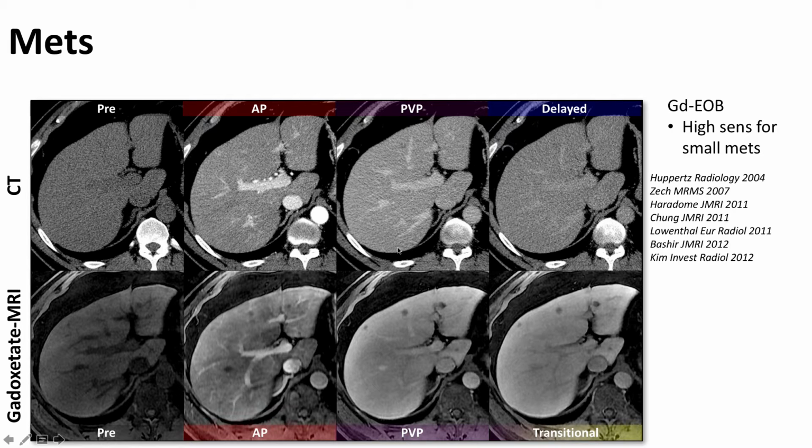Let's review some of this. All right, here's a patient. This is, I think, 2009, one of the first cases we did. The patient had a CT scan. Does everyone see the metastasis? It's pretty subtle, but it was actually detected. It was hot on PET. So the metastasis is right here in segment 4A/B. It's right there. There's a metastasis.